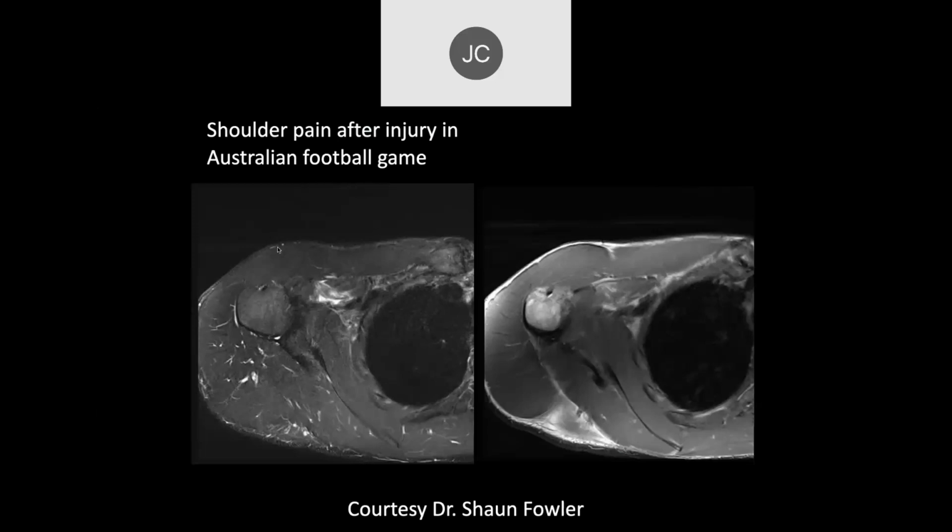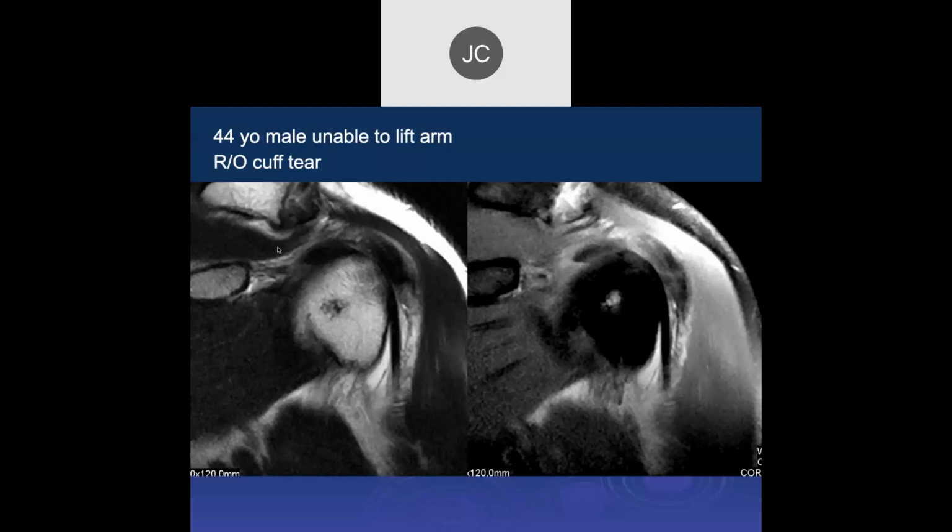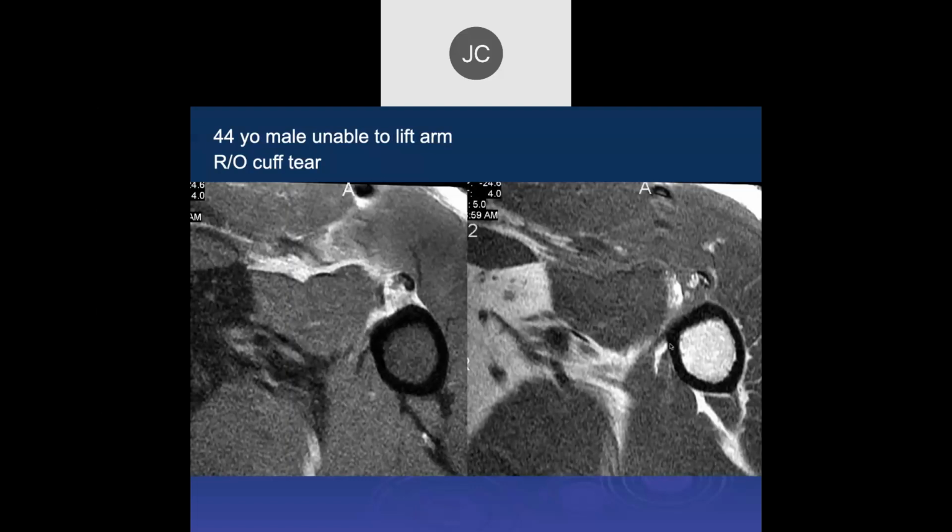And that biceps was dislocated as well. I don't know. There, the biceps looks okay. I think the biceps is okay here. Okay. I think that's all edema from the tear of the pec.